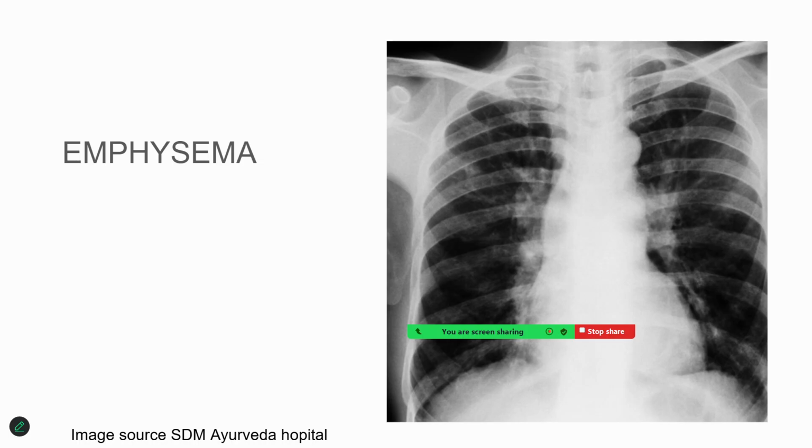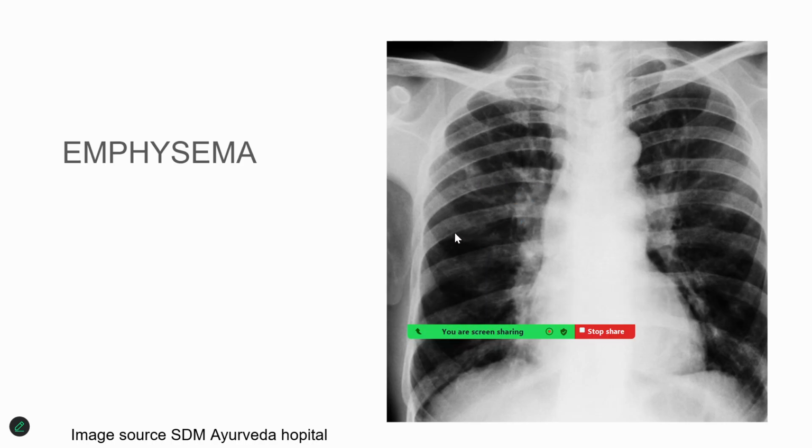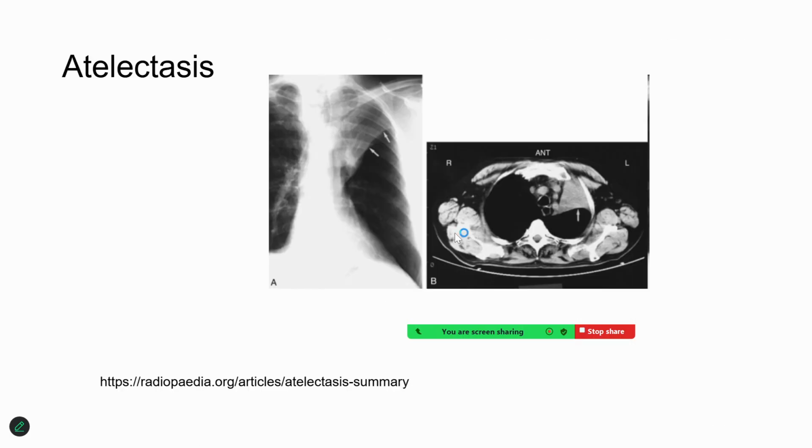Emphysema is a locked air sign, which also is a consequence of the same lung tissue pathology, where the patient would have alveoli which have become flattened, and hence the air becomes locked in. The density of the air would be more. The typical vascular markings may not be seen as such. It looks as if it is an air-containing balloon-like appearance, or there could be even a partial collapse of the lung tissue, which is called atelectasis.